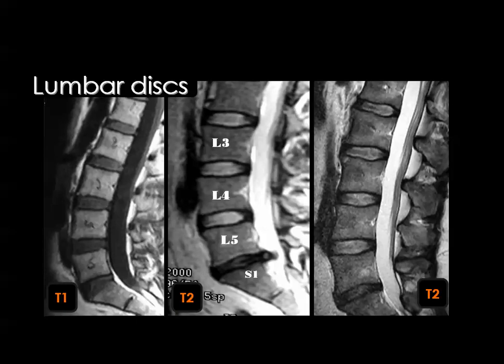I will also discuss the details of spinal canal stenosis in the lecture on degenerative diseases of the spine. But now we are going to evaluate the disc.